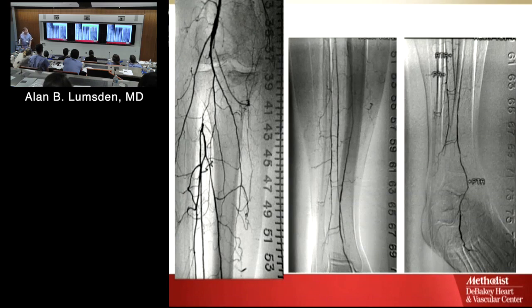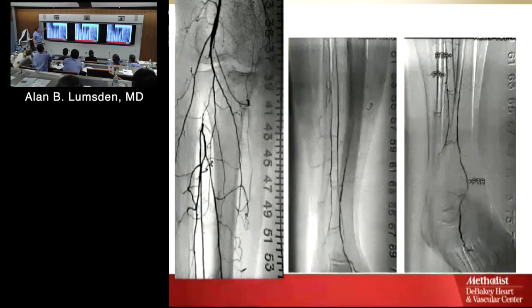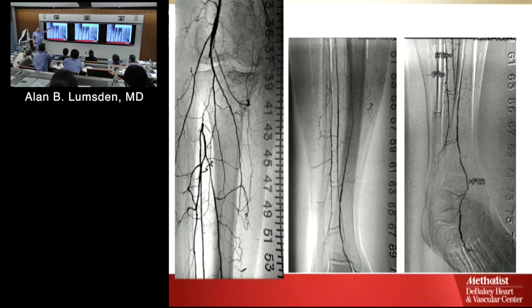All righty. So, watch my finger. What's that? Popliteal, above-knee popliteal. Okay, what's this? The knee joint. Everything's going to be described in relation to the knee joint. Well, this one's a little trickier. What's that? No, we're above the knee. A lot of collaterals. It's not one of the vessels that you would know. These are geniculate collaterals, okay? But it looks like it's the continuation of the popliteal. Popliteal probably occludes right here. This is probably coming anterior or posterior.